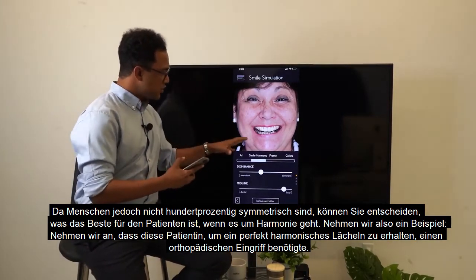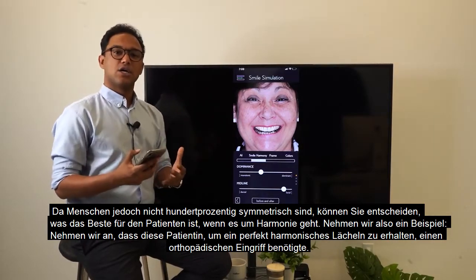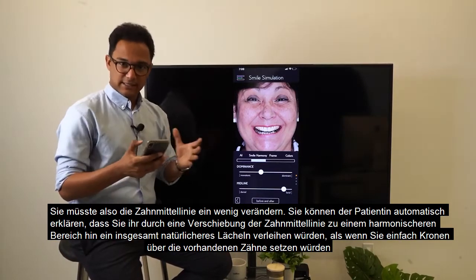Let's say that this patient, in order to get a perfect harmonic smile, she would have to do some ortho procedures. So she would have to change or shift the dental midline a little bit.